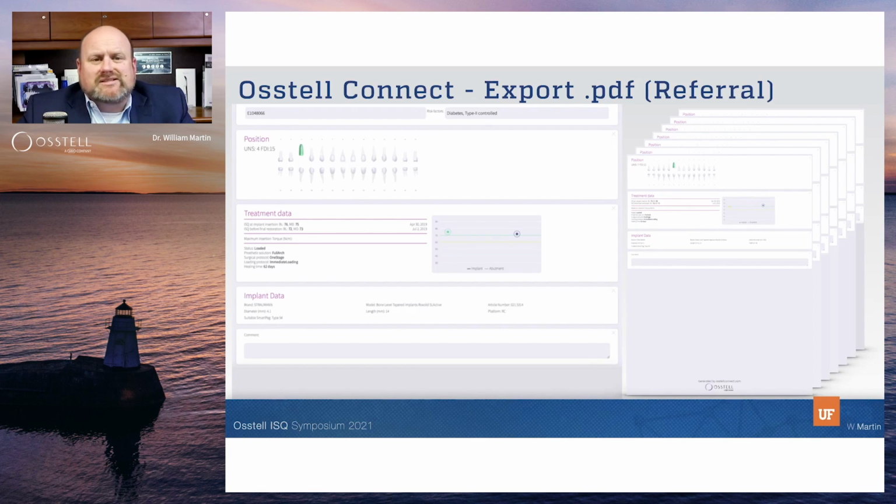While this is an implant stability report, in many ways it's kind of like maybe an implant tracker as well, and we've all seen different software programs out there that have tried to emulate trackers and so forth. The nice thing about this is it's free for use, and I can tell you, I've been beta testing this and giving information back to our friends at Osstell, and they're continuing to develop this. So what you're seeing on the screen here is just like version 1. I think we're going to see some great growth with this over time.